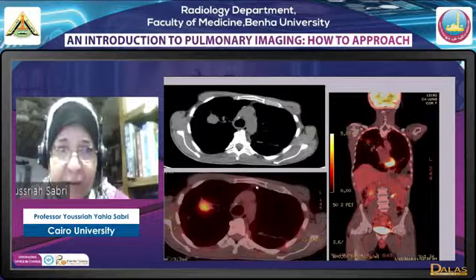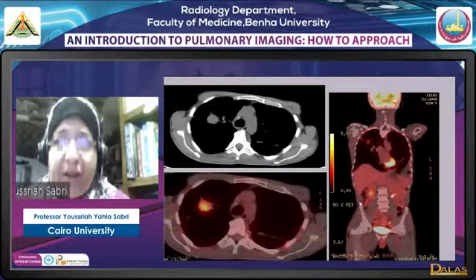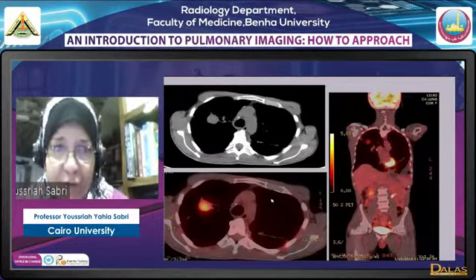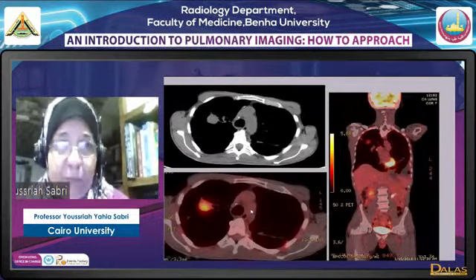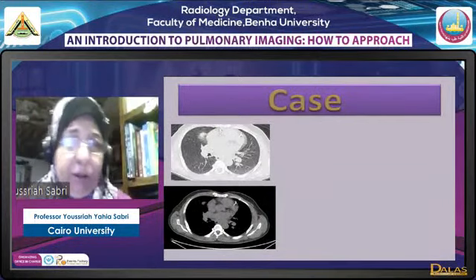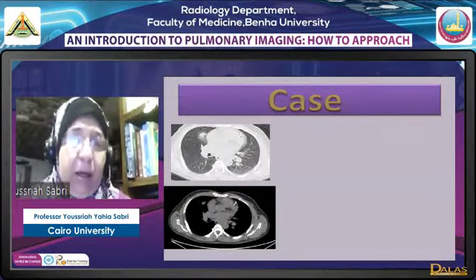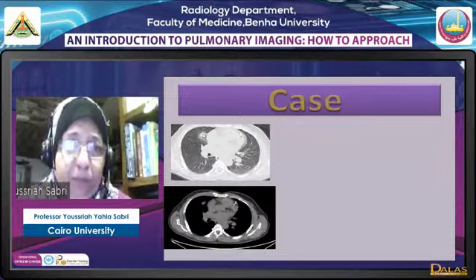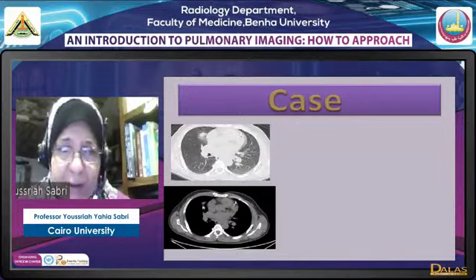Okay. And this suggested a scar, a carcinoma, which was proved to be an adenocarcinoma. Okay. Here we have a patient coming with hemoptysis. Lung window showed a subsolid nodule, as you can see, partially solid, partially ground glass. Okay, partial of it is of soft tissue density in the mediastinal window.